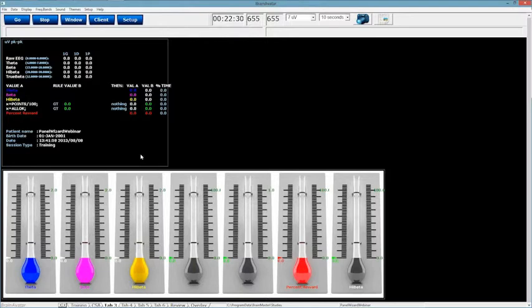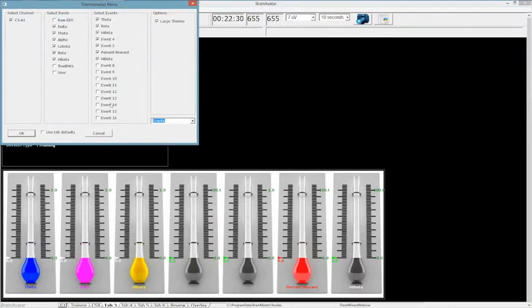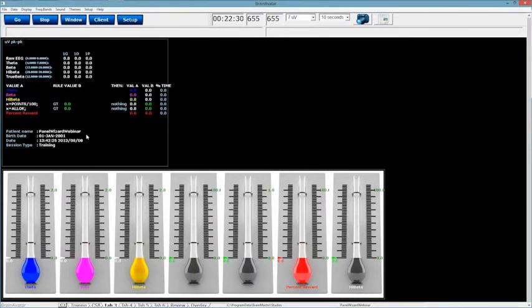Now, let's go into a little bit more designing off of some of the information that I have right here. What I'm going to do is make a customized screen about all Event Wizard information, and I'm going to do it by using some of the different graphs. So I'm actually going to customize this back down. Well, actually, we're just going to leave this information right here. I'm going to right-click.